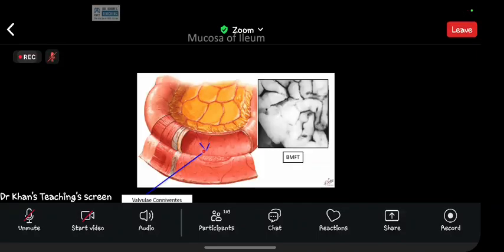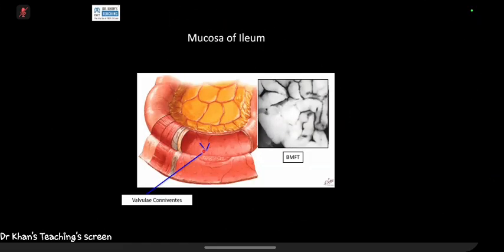Exam film. Jejunization, I'll show you. So the mucosal fold order reverses. Because the jejunum gets destroyed, the ileum is trying to help, and there is regeneration of mucosal folds. In radiology, this is how you diagnose it, right? So that's a very popular exam film, jejunization of the ileum.